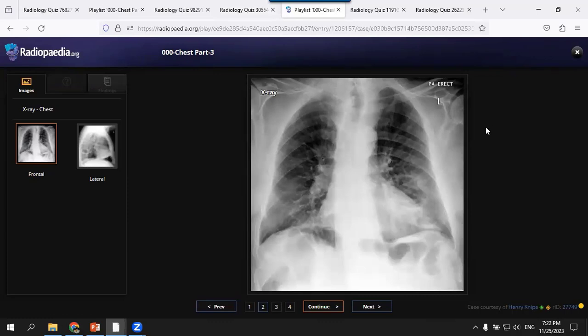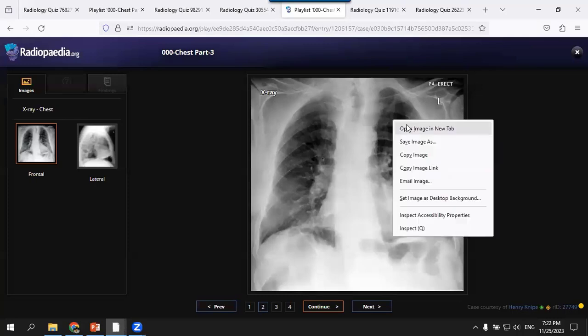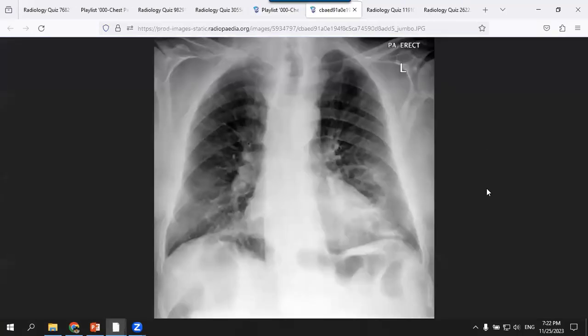So this is a chest radiograph of an adult patient demonstrating opacity in the left lower zone and the right upper zone. There is a scoliosis and thickening of the right paratracheal stripe. I'm suspecting that there is... This is positional. You comment on this area.